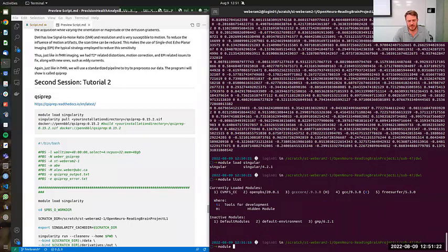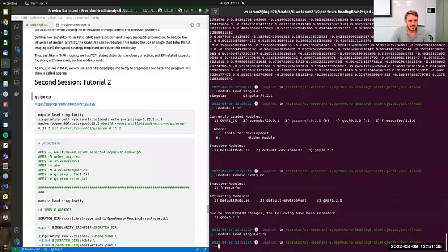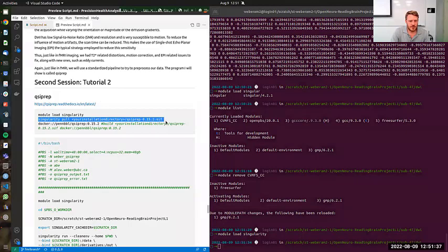Oh, I think it's because I have the Compute Canada. Yeah. So remove CVM. There we go. So we can load Singularity, and then we're going to want to install this somewhere.